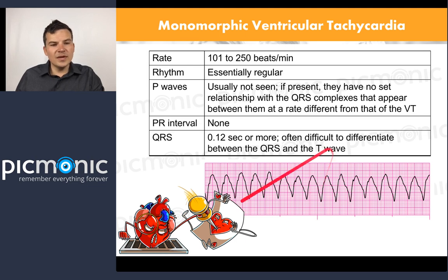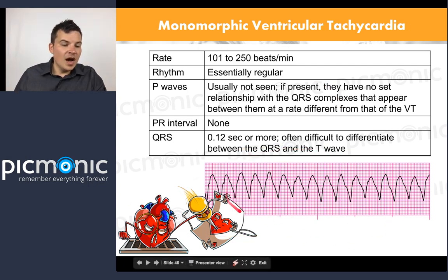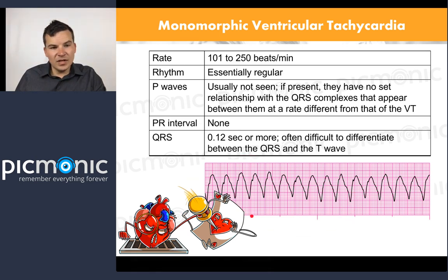What do I do with this rhythm? What's the treatment here? Give them a hug, right? Just give them a hug. So the first thing you want to do is always, if you see a rhythm like this, check the patient. What do you need to check? You need to check their pulse. Because you can have ventricular tachycardia and be talking, walking just fine. Now, you can't do that for very long, but you can do it. And that's what's really important. It doesn't work forever, but you can do it.